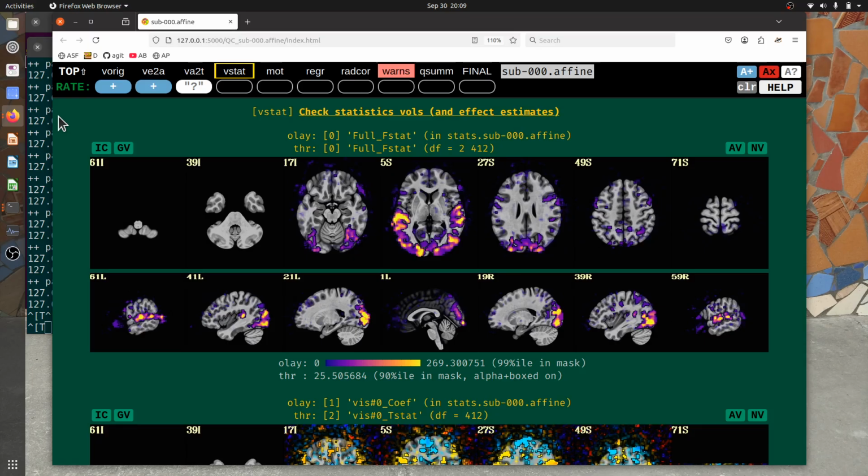Just to mention again, we are processing task-based fMRI with an audio and a visual reliable task. Each audio and visual are actually slightly mixed in there. So there's a strong visual component along with simultaneously a weak audio one, but we just call that viz, and vice versa for the audio task.